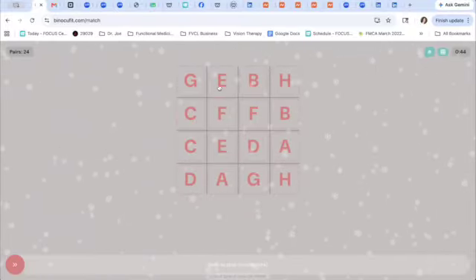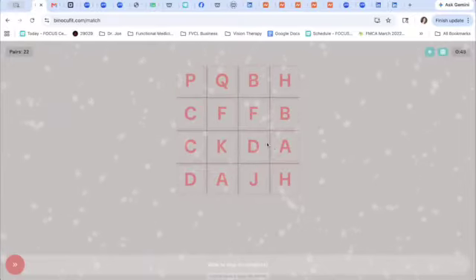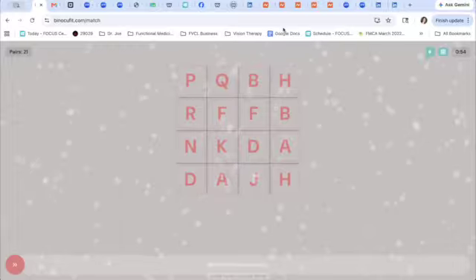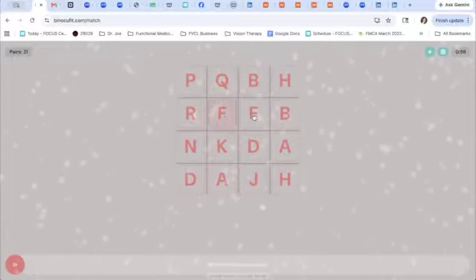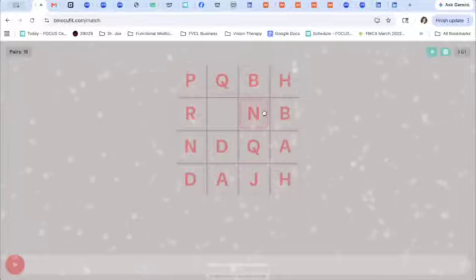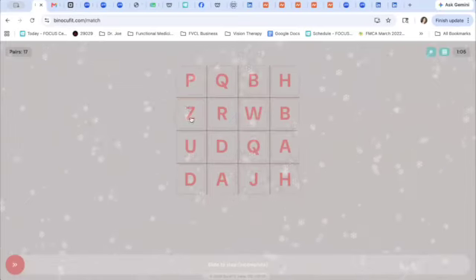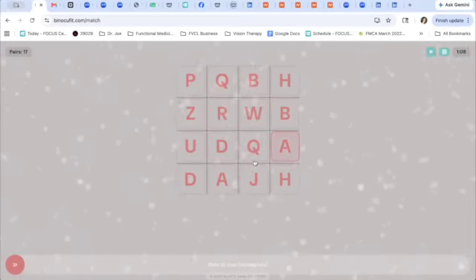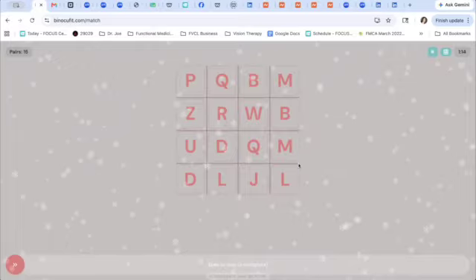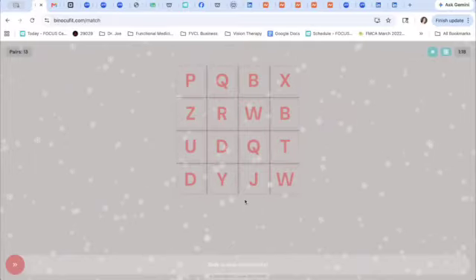But if I show you here, I wanted to show you this 4x4 so that you realize, and you would have to train somebody into this, or at least let them know that this is what's going on. Or any savvy kid could probably figure it out. But once there's an empty spot, you can move the other cards so that it reveals what's underneath. And that's important because sometimes the match isn't right there for you, and it is hiding under something else. So I just wanted to demonstrate that piece for you.